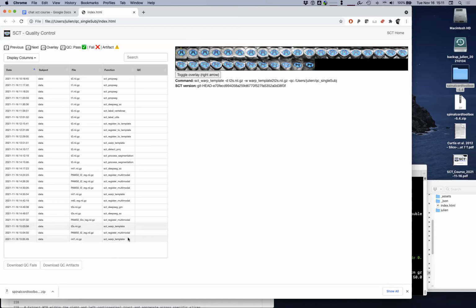Quite frankly, I find that the previous one was already working pretty well. Sandrine, you might also want to add a note mentioning that there are much fewer slices on the gray matter based registration, because the coverage is not the same between the gray matter and the anatomical scans. That's also introducing a lot of confusion.